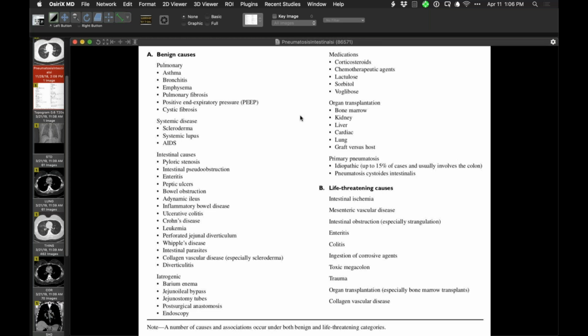She didn't develop anything, and she did okay from the abdomen point of view. So rather dramatic, but benign, even with the presence of some air outside of lumen of bowel. She did okay. They did an abdominal CT, I'm trying to remember, but there were no findings there to suggest anything serious. So a nice example of that.